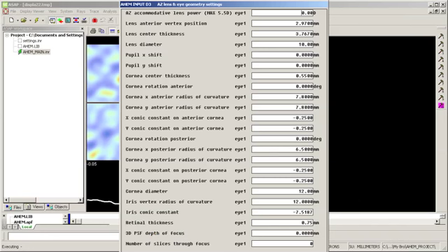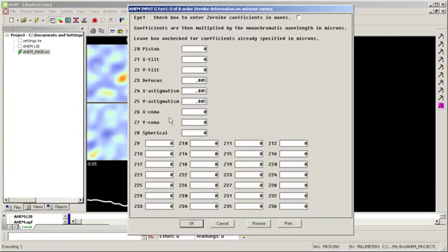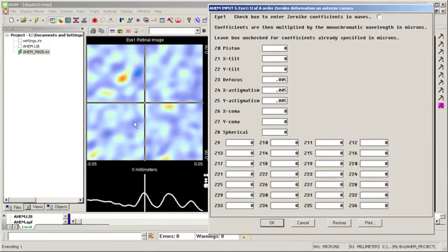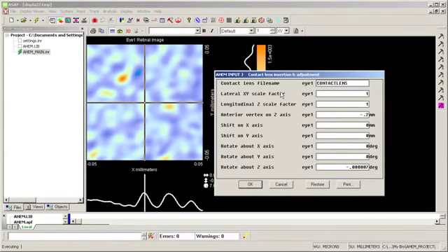So I click OK. And my basic eye geometry is shown for the AZ eye model. Click OK again. I don't need to change anything here. And this was the aberration on the cornea that created this retinal image here, this aberrated eye. I've got basically no point spread function because I put this aberration on this eye. So I click OK, and now I get prompted for contact lens file name.